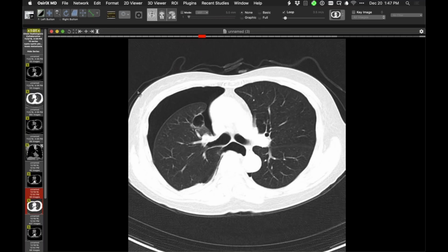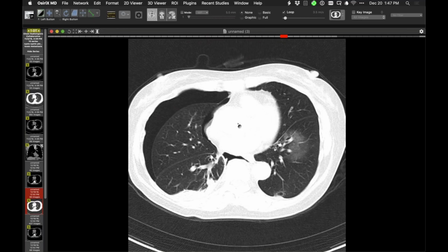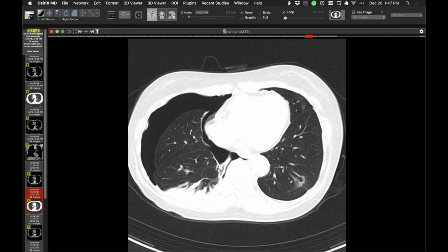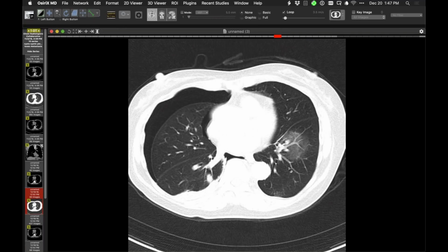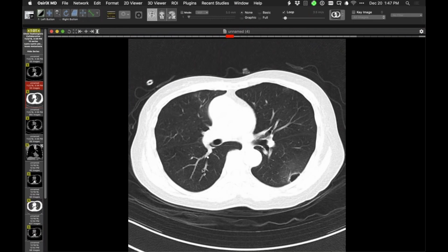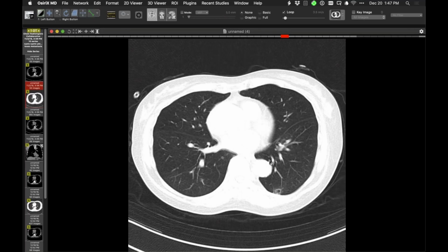Howard, do you think the ground glass could be hemorrhage from this vascular lesion? Yeah, that's what we always think of, don't we, when you see angiosarcomas. Look at that interesting ground glass right there. I'm not sure I see a lesion there. I was wondering if that's part of the tumor and not necessarily acute hemorrhage, because sometimes you'll see them all look like this, or they're like that on multiple studies, and it's just the little vascular channels that grow from the tumor that aren't dense enough to cause a nodule. Yeah, there is a little ground glass opacity there, just a little before on the previous exam.